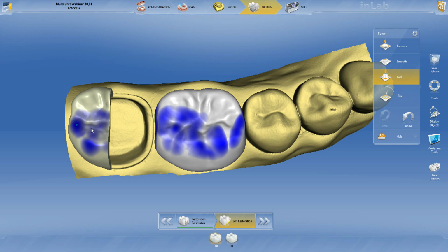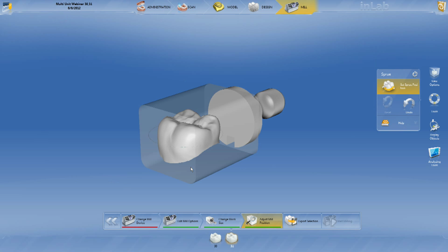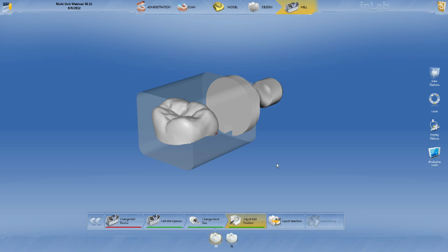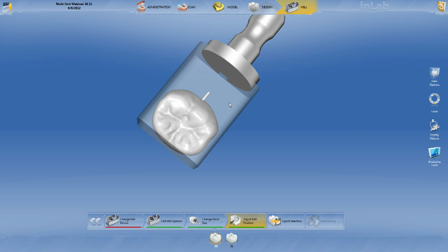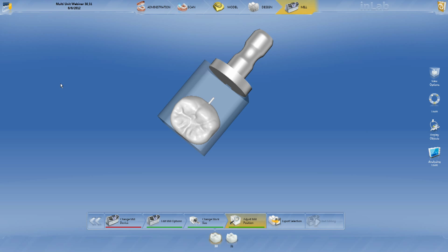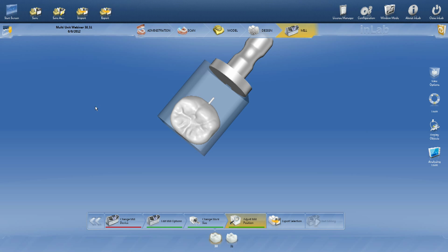Okay. We do the same thing with the... I'm sorry. So we move forward. Okay. I mean, that's how easy it is to basically do two crowns, number 30 and 31. Let's move on and go to our next case here.